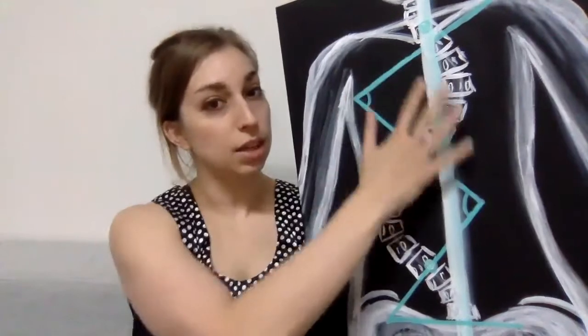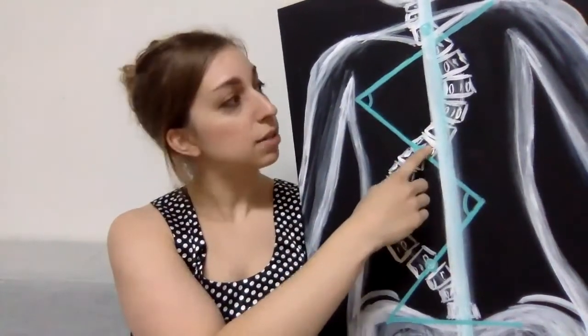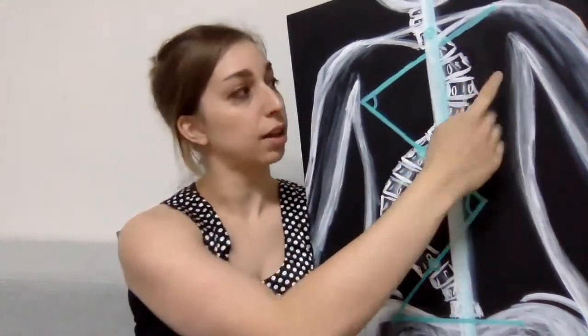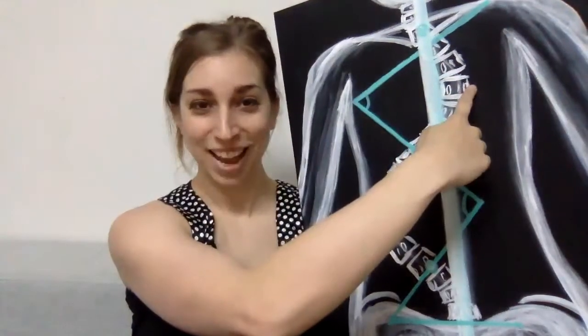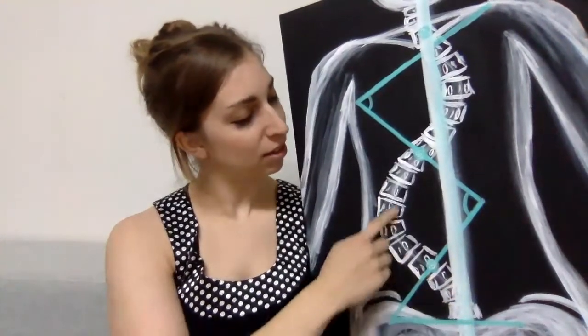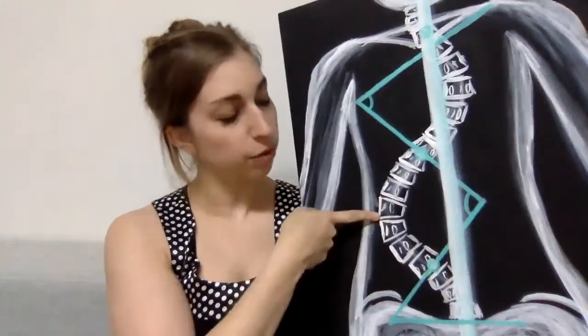In order to understand your Cobb angle, you need to know what the apex of your curve is. So let's look at the top one first. In this thoracic curve, from here to here, my apex is the part of the spine that is going furthest away from midline. So we're looking at about right there is the apex of this curve. For your lumbar spine, the low back, if we're looking at what part extends farthest away, I would say right about here is the apex.